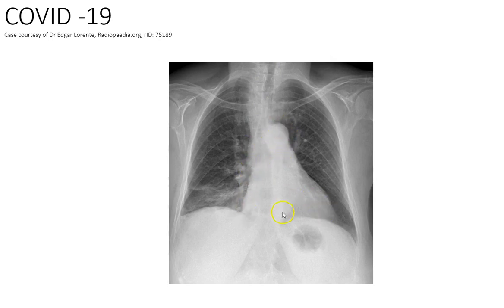So this is the heart. It's about half. It's not clear whether or not this is an AP or a PA from what I've been able to retrieve.